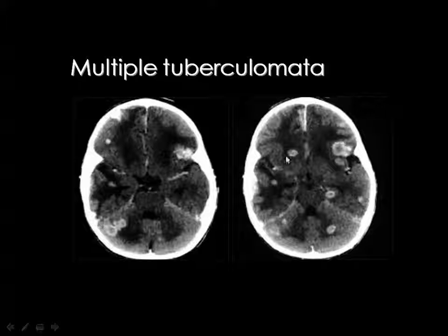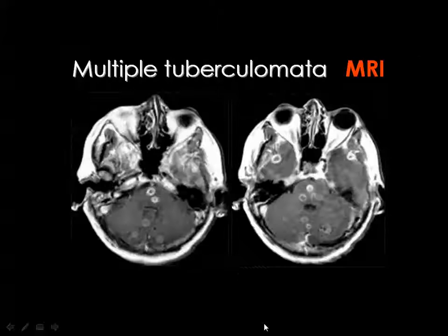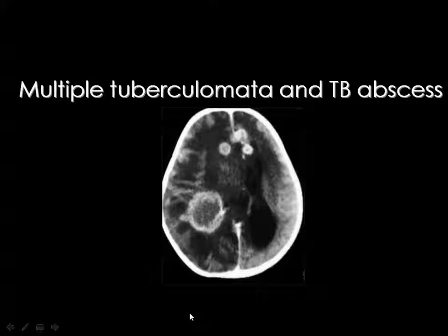And most of these lesions are small and surrounded by variable amounts of perifocal brain edema, reflecting the activity of the disease. And here is the typical appearance of intracranial tuberculomas, showing the classic buttonhole appearance with variable degrees of surrounding perifocal brain edema. This is an MRI post-contrast T1 weighted image, showing multiple tuberculomas in the brainstem, in the cerebellum, in the temporal lobes, showing the classic appearance of tuberculomas.